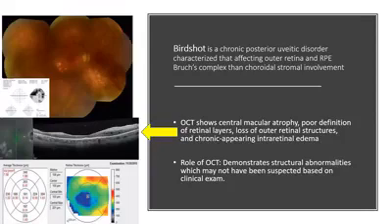And if you look at the macular area, it's quite normal. And when you look at the OCT, you can see that there is destruction in the photoreceptor layer and the external limiting membrane. And looking at the thickness map, there is a tremendous thinning. So another advantage of the OCT is the detection of the destructive effect caused by posterior uveitis.